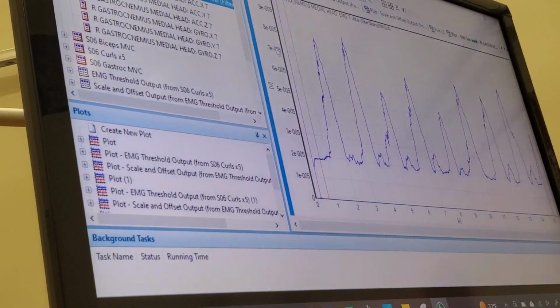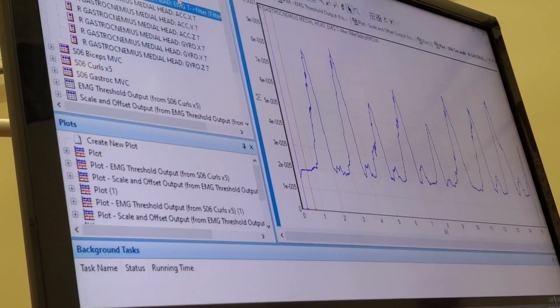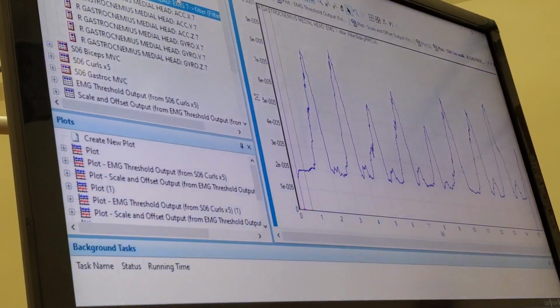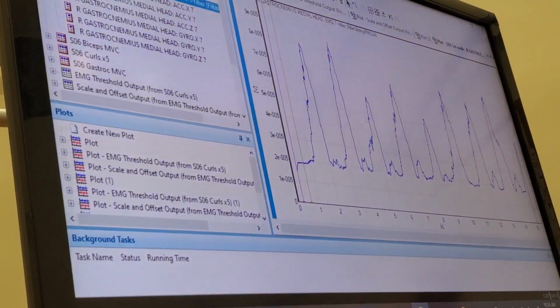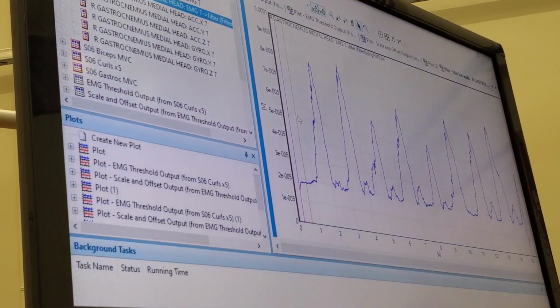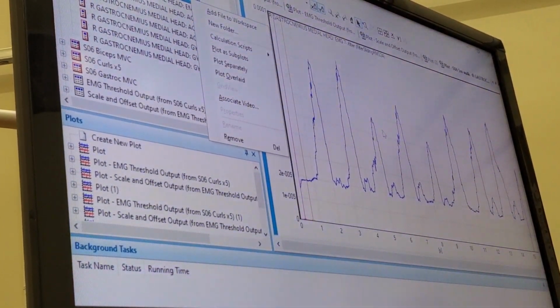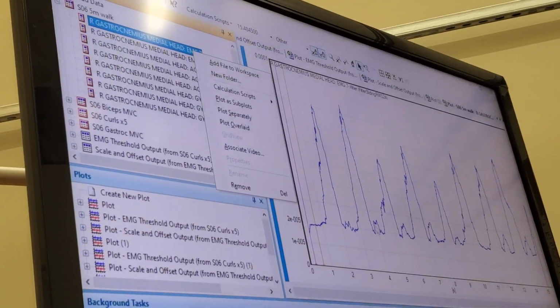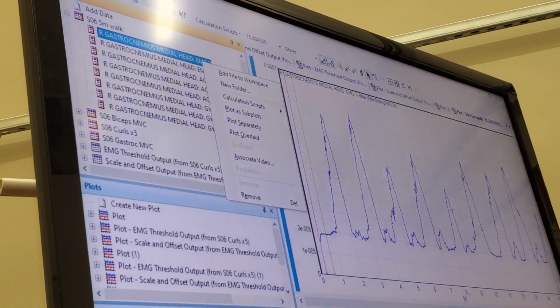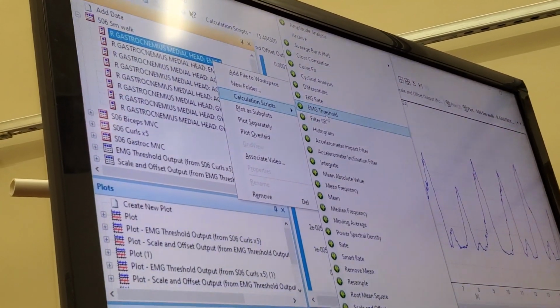Were we using the second sub data? Unlike last time, we were always using the first sub data. Well, I was just graphing this. You're talking about using the raw data? The first one is the raw data, right? Correct, yeah. I was just graphing to see if this was a cleaner setup to do the threshold analysis.